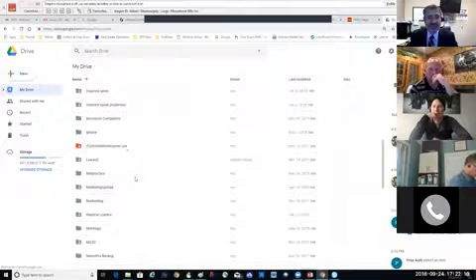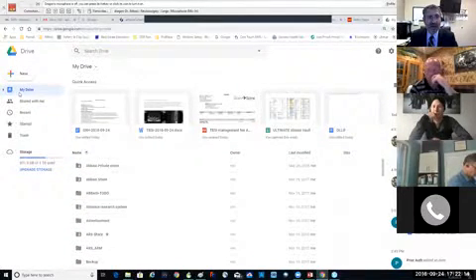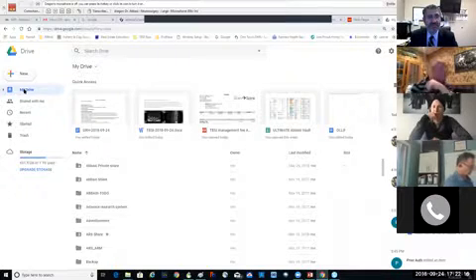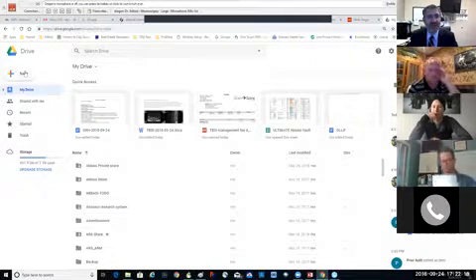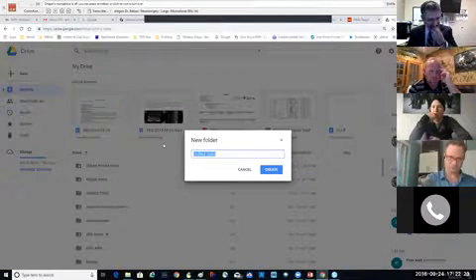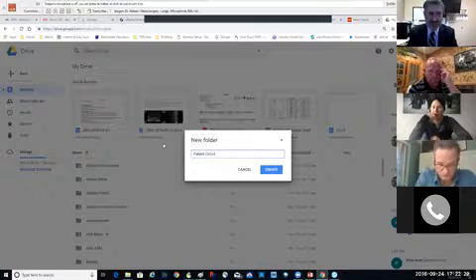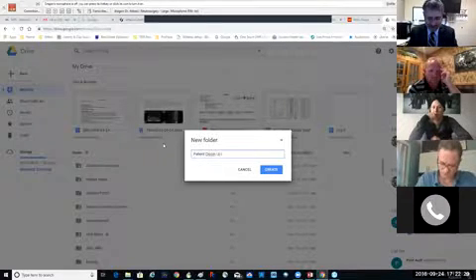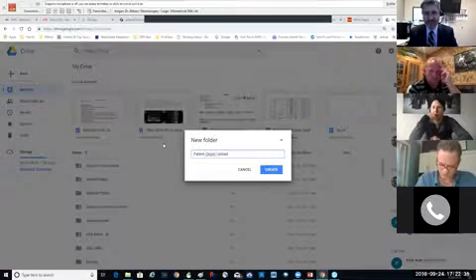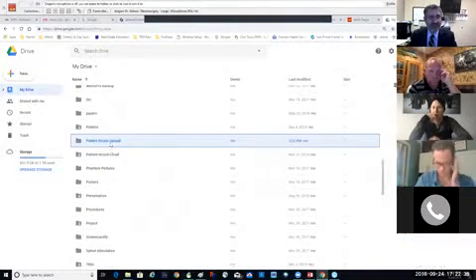For example, in my Google Drive, I can make a new directory folder, patient DICOM upload.